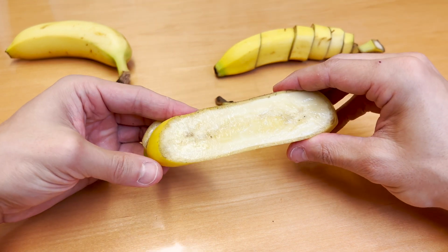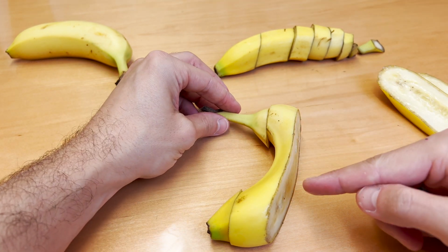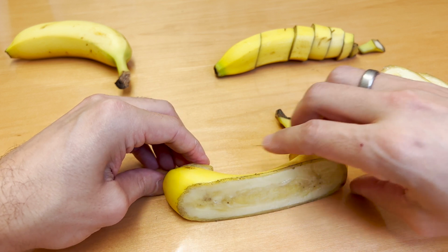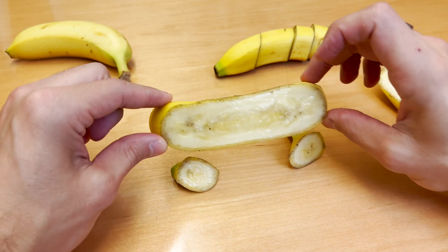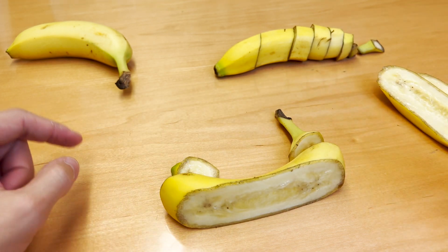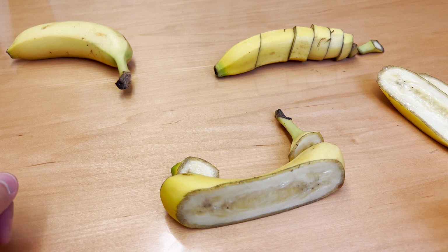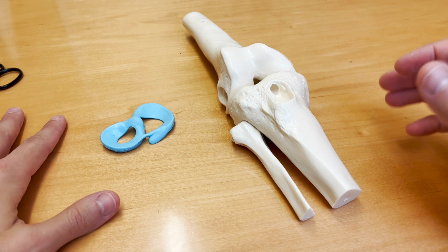And then as we move through the image again to this cut, from this cross-section to the cross-section here, we can see all of a sudden, instead of it looking like a single object, now it looks like there's two objects. And so that's actually what the meniscus will look like when we show you on the model. And so that's pretty much how the MRI produces image through cross-section, whether it's a piece of fruit or anatomical structure. All right, so now we're going to demonstrate how we make these cross-sectional images on the knee.